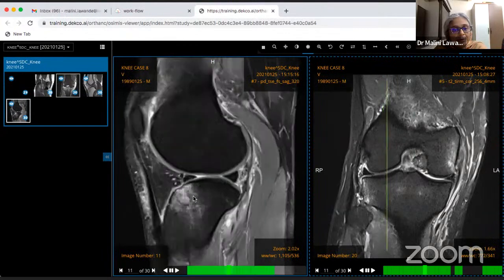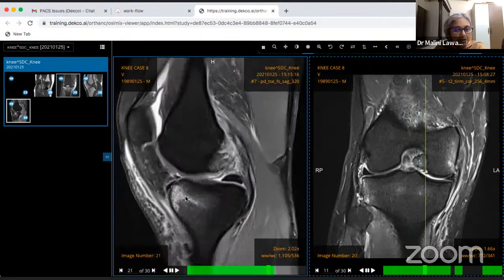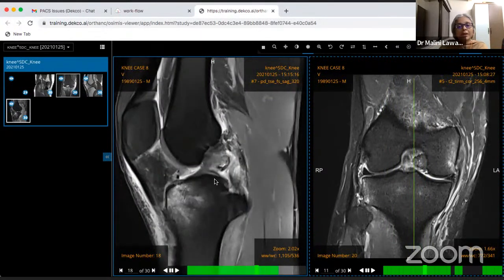Here, what do we see? The marrow edema is all predominantly anteriorly in the tibia. Now, marrow edema can be due to a few causes. One, it could be direct impaction: something is hitting the bone. Or it could be avulsion kind of forces: something is pulling on the bone. Or it could be reactive to something else, like infection or degeneration pathology.